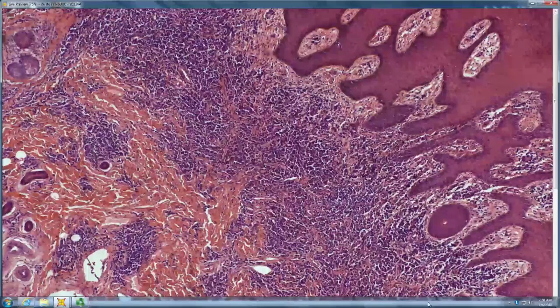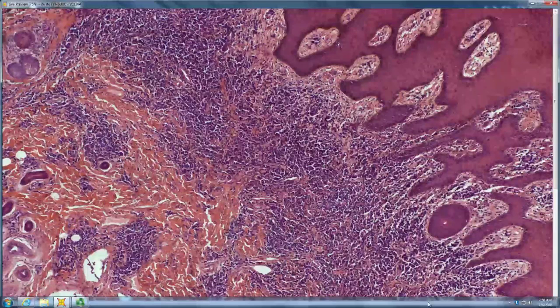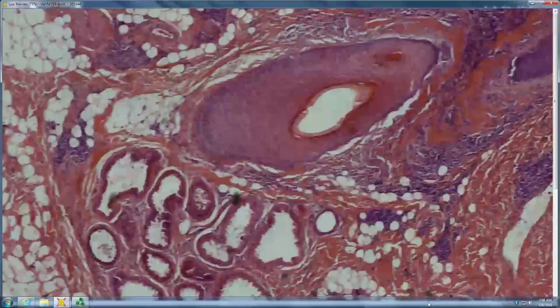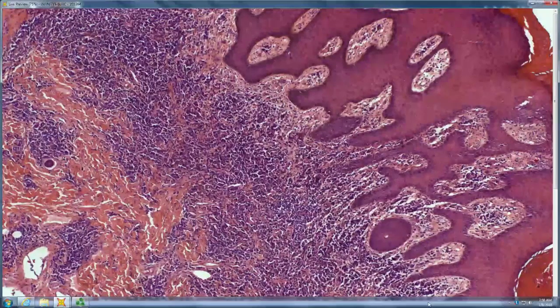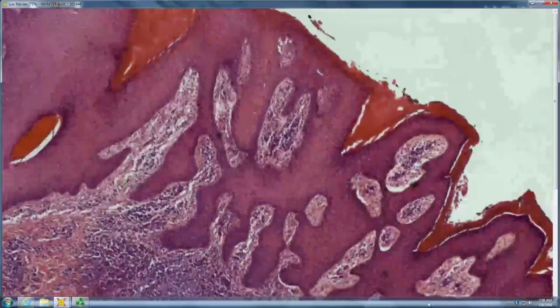And it was patchy, like a congenital nevus would be. But in this case, all plasma cells. So you're on an apocrine gland-bearing area. You have sheets of plasma cells. Yeah. I mean, syphilis.